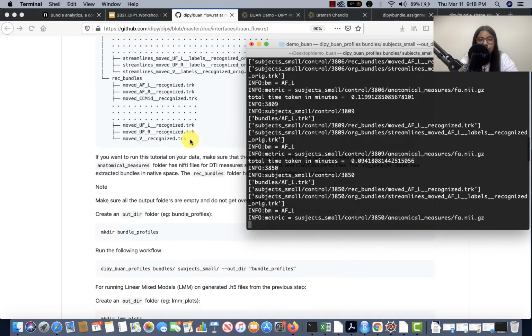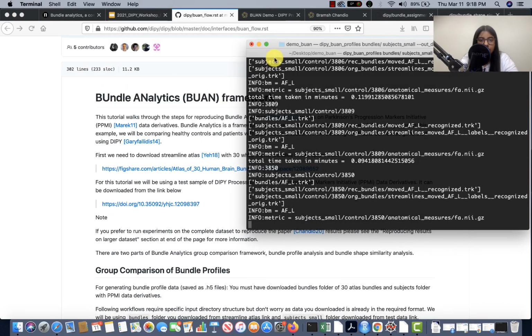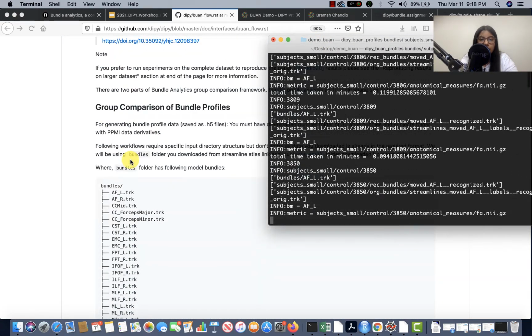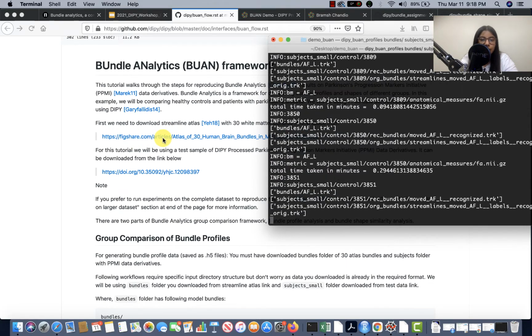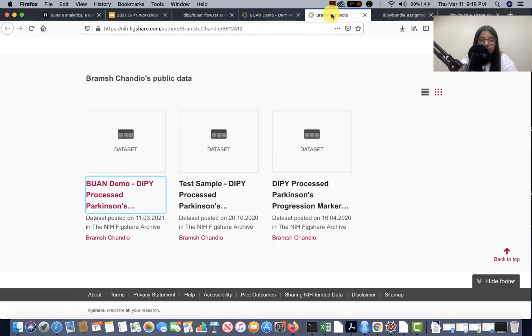Let me show you this dataset that is in the bundle analytics tutorial, the original one. Here we have data for 30 bundles and whole brain for you, and in this one, let me show you, I have compiled 3 data sets.